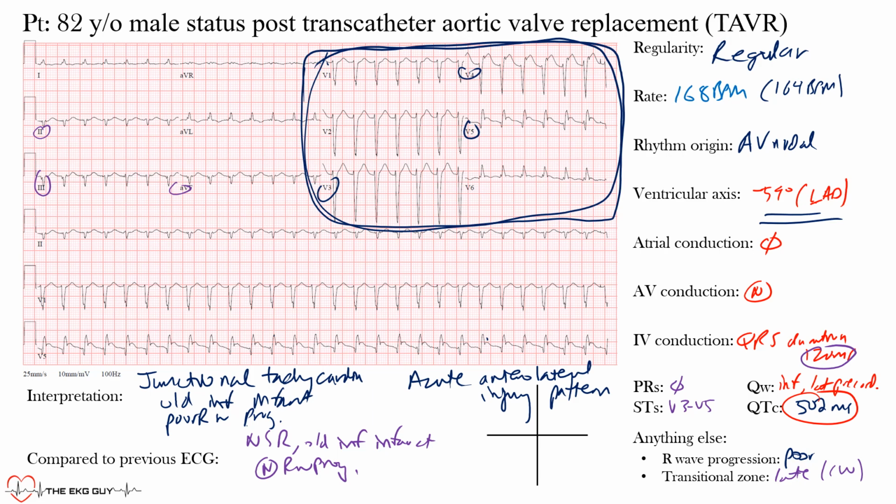You know, it should also be noted that there's some T-wave inversion here that's also present here in V6, on those lateral components. So anyways, that's quite interesting, and let's not forget the prolonged QTc that we noted here. That's something that you can see with ischemia or any infarct pattern. So, quite a fascinating case. He's doing well, which is always the best thing.